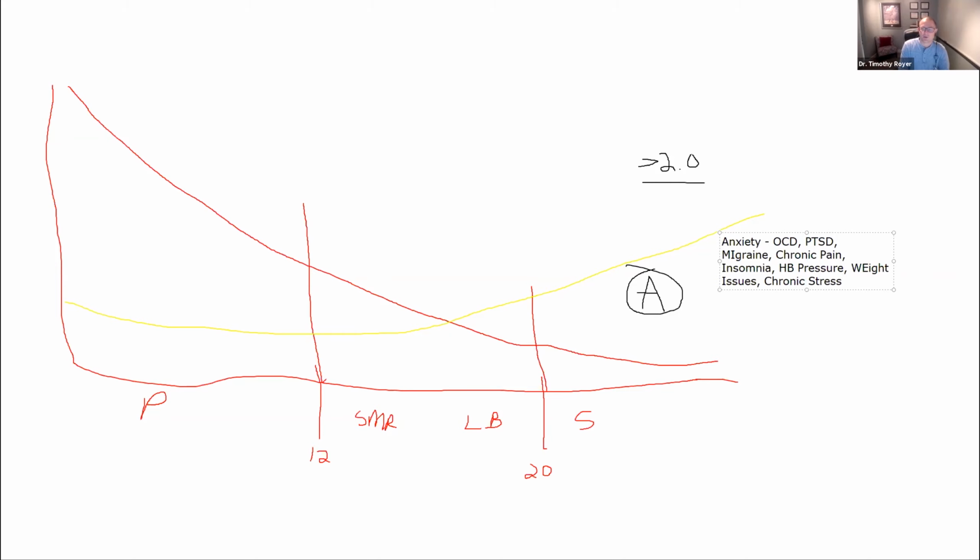We've talked about these things that are all sympathetic. You remember Why Zebras Don't Get Ulcers book. That's going to be all things when we start to see the yellow line start to tail up, not the red line, but we start to see these frequencies that are elevated, that we know that we've got too much of those high elevations in those fast frequencies, okay?